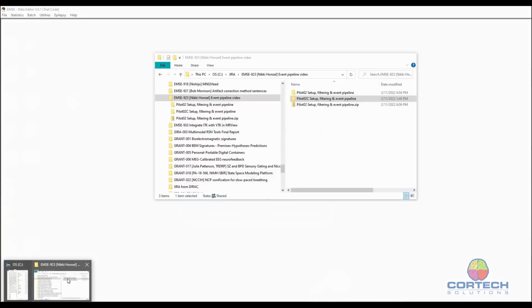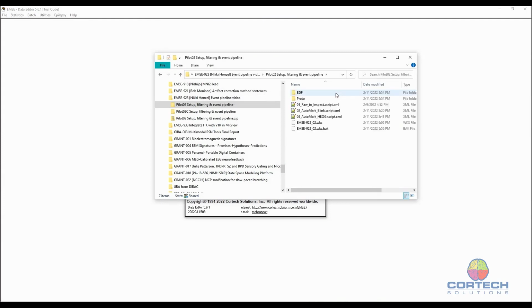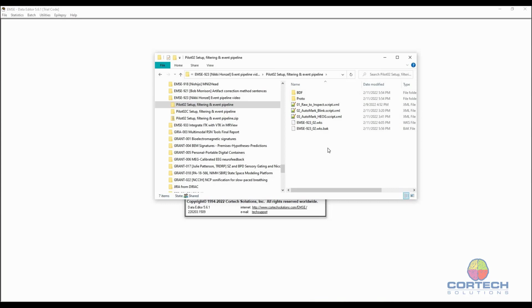And let me look in a folder here. Okay, so what I've done, I have a folder. Oh, by the way, there's a zip file here that I'll provide, which is basically the initial state of this folder. This other folder I'm showing here, I already went through it once, and so that's essentially where we're going to be going. But this zip file is the same as this file that I'm starting with.